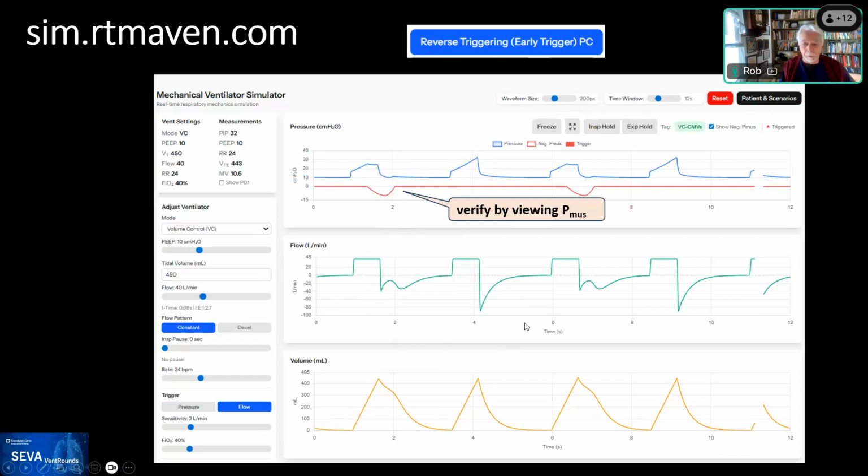Any comments, Eduardo? No, yeah, I would just highlight that having a marker that this is a patient trigger breath versus a machine trigger is very useful, but I think that there is enough information on the waveform for you to be able to come to terms with that. Especially in this example, in which you have a breath that is completely passive with a nice step up and then the gradual rise.